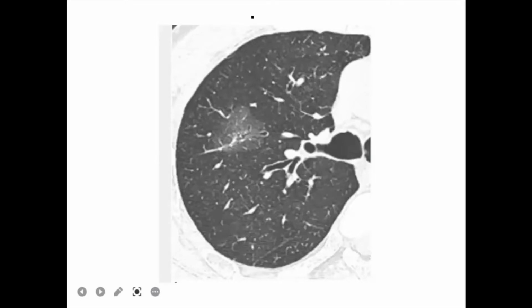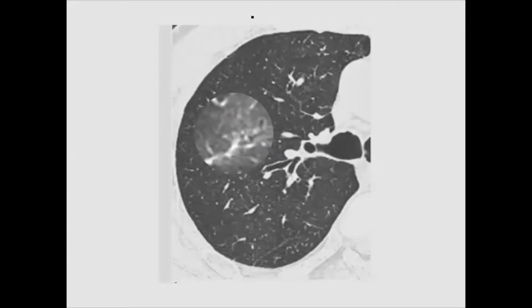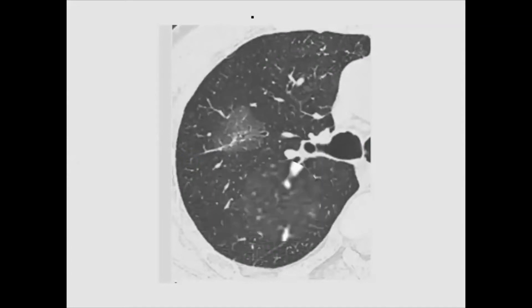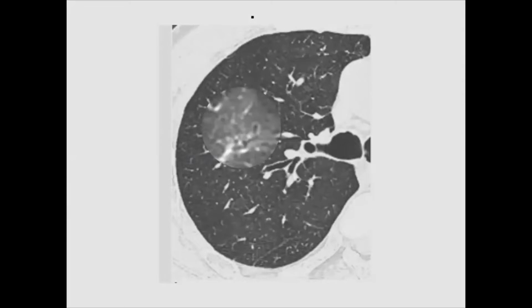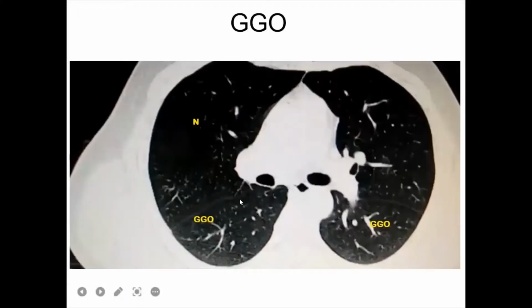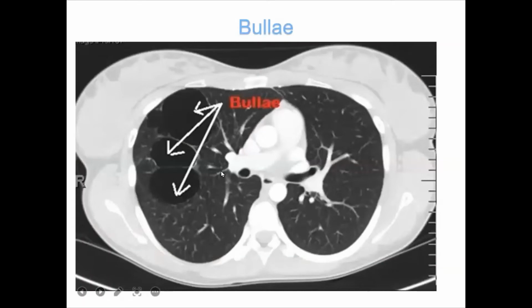Here you can see this part is actually denser than the other part of the lung. It could be due to interstitial space or alveolar involvement, maybe pneumonia, infection, pulmonary hemorrhage, alveolar proteinosis. This is pneumonia and also COVID pneumonia. This slide demonstrates that GGOs can involve a larger pattern. Here you can see the normal lung, and this is a lung of increased density. Let us proceed.